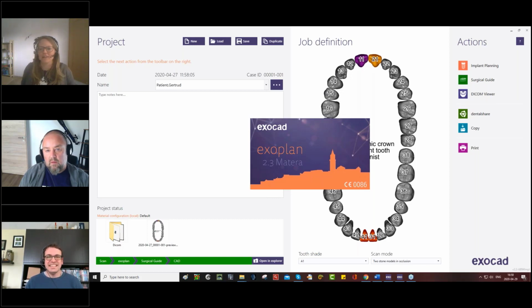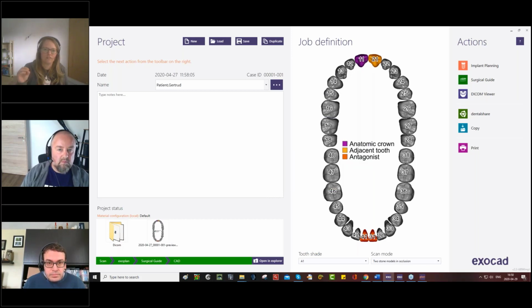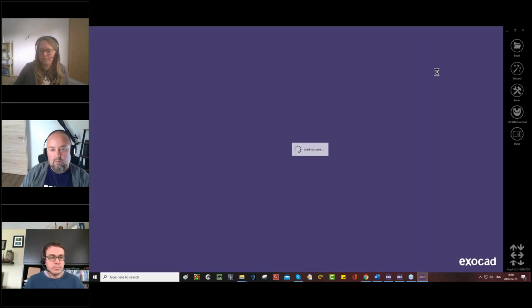The idea is that you set a threshold value, which colors in. You decide at what density level you show as blue. It doesn't say anything specific about the density in different areas, more than that the red areas are less dense than the blue areas.